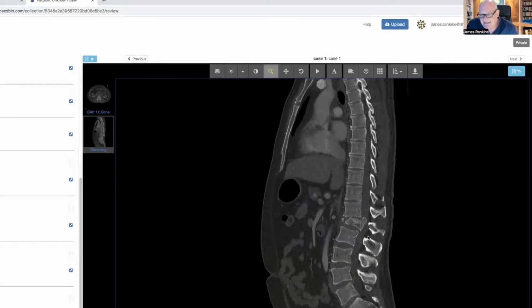Now, this is an axial compressive fracture, so the forces come straight down through the spine, and this is a burst fracture. What this means is that the force has gone down through the posterior elements as well, and the posterior elements have been crushed just as the vertebral body has. And of course, the vertebral body and the lamina and the pedicles are a ring structure.